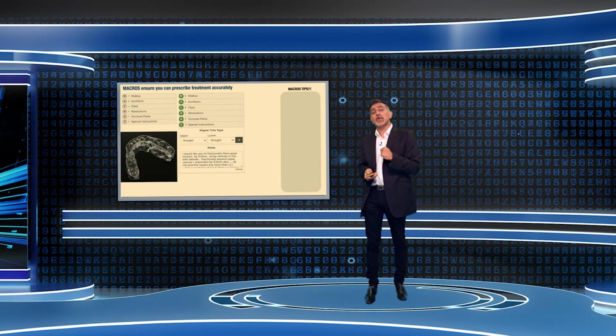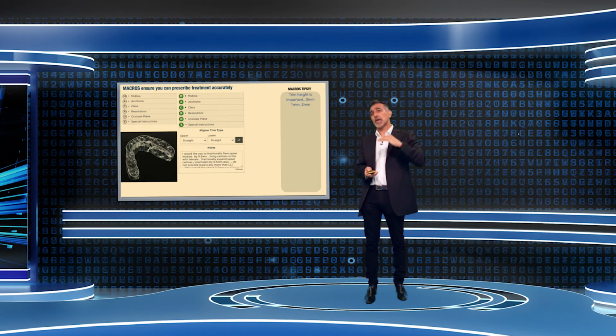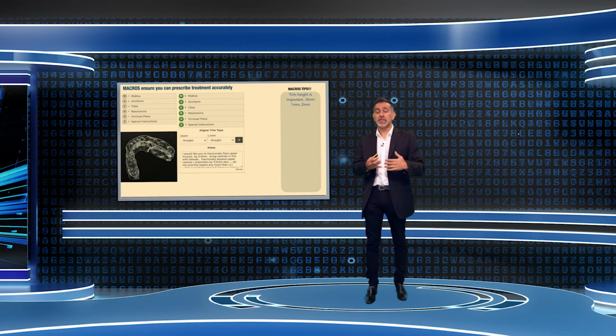And then finally, we've got special instructions. Here you've got the ability to change the trim height. So again, the trim height is important. It depends on the initial movements.